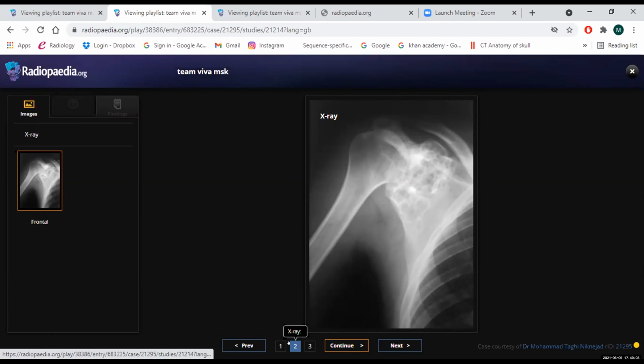So this is a 30-year-old male with limited range of motion. I can see that the subchondral region of the scapula is involved. There is a multicystic osteolytic lesion with septa seen. The lesion is expansile and has a narrow zone of transition. I cannot see any matrix in the lesion, no associated soft tissue component, and it seems to me that it is a benign lesion, likely GCT.